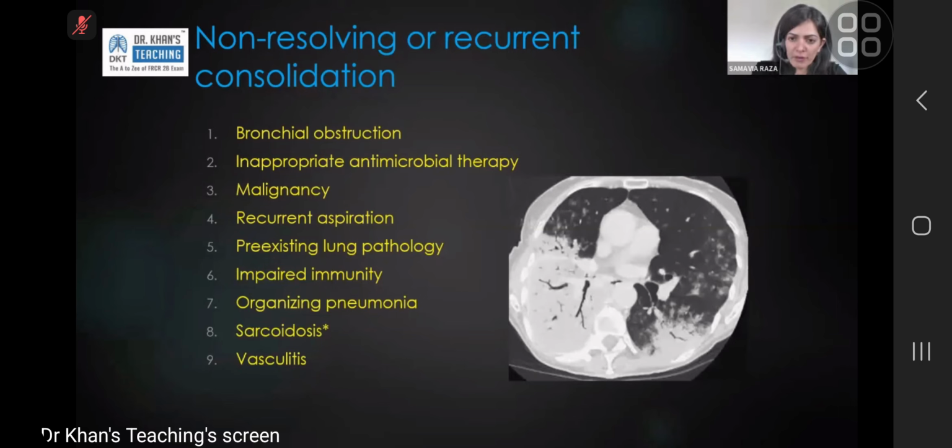You want to recommend follow-up at 6 to 8 weeks to ensure resolution, whether you are sure or not sure that this is infection. What we want at the point of 6 to 8 weeks is complete resolution. When you have incomplete resolution, that is reassuring, and depending on what the specific appearances are at that time, you can either let it go, or if it's still a bit of airspace and a bit of nodular, fluffy looking appearance, you can recommend a further 6 to 8 weeks follow-up.